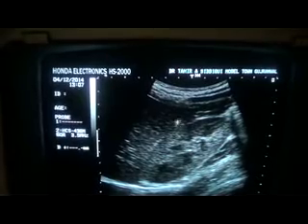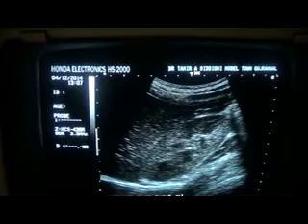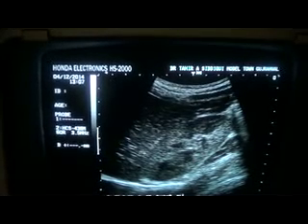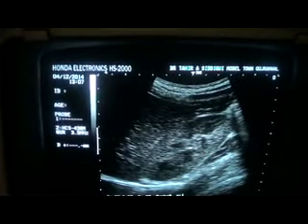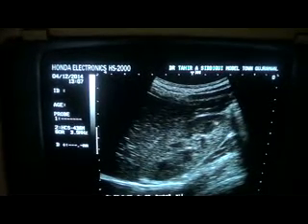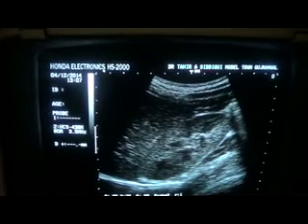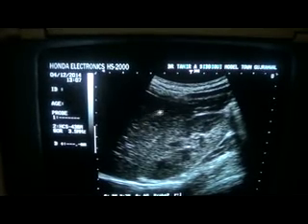renal pathology. Now for this, the condition is that the liver should be normal. If the liver itself shows decreased echogenicity, or its echogenicity has gone down because of some pathology, any pathology, let's say CCF, hepatitis, etc., then you will also see the kidney parenchyma echogenicity raised as compared to that of the liver. And that will be because of the adjacent diffuse decreased liver parenchymal changes.